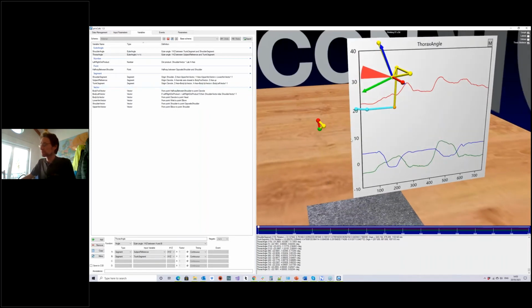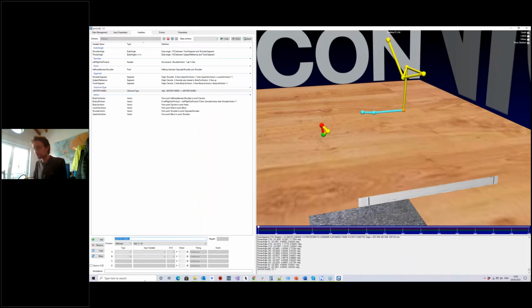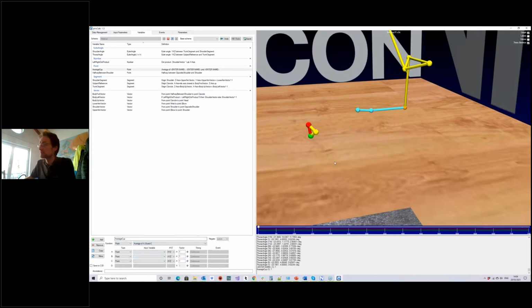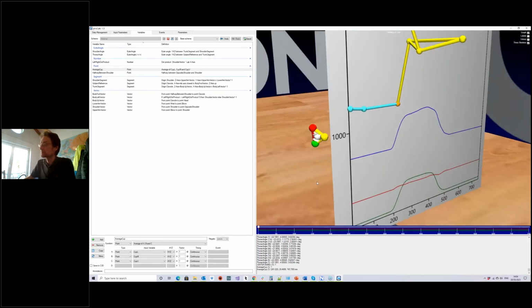So the first thing I'm going to do in order to establish the position of the cup is actually to create a new variable called average cup, which is nothing other than the average of A, B, and C, i.e. the 3 markers on the cup.